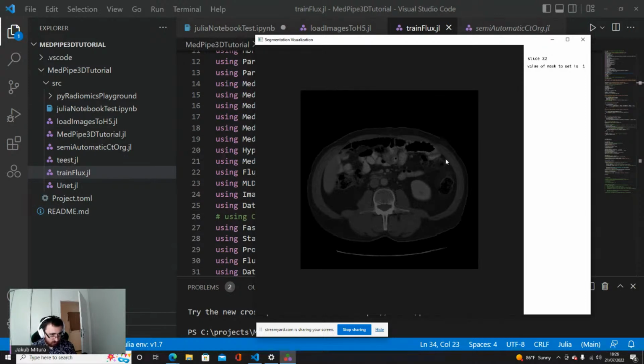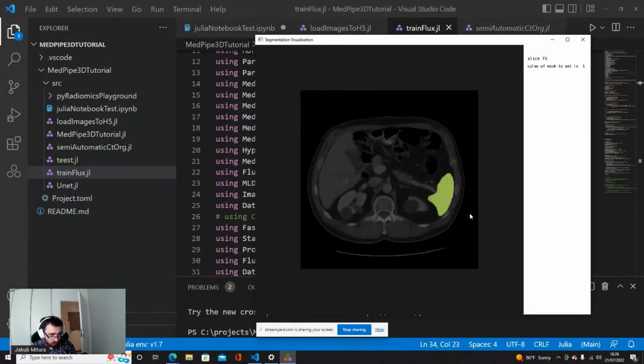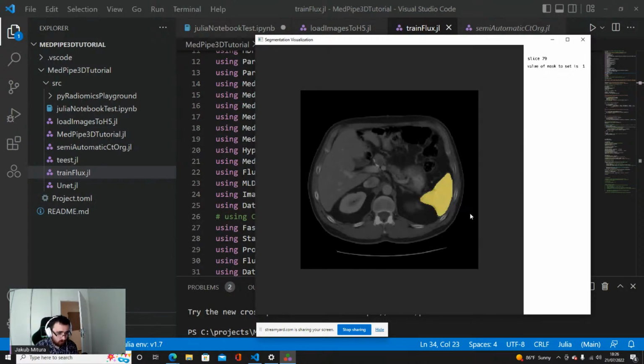So in the state of the art, basically, one chooses the median of all of the 4 corners and sets it as the background color. But here I wanted you to see the padding. And here is the output of the algorithm. Yes, I will show you which one.